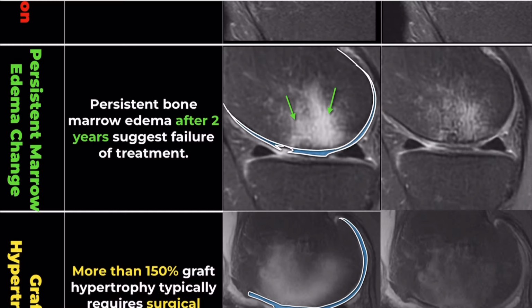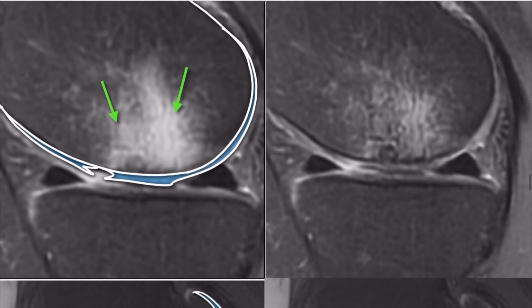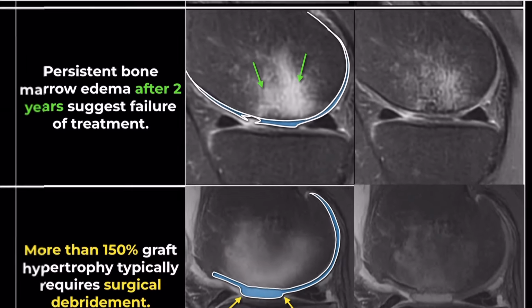4. Interface between repair tissue and native cartilage. A smooth interface without gap formation between the repair tissue and the native cartilage generally indicates successful integration. However, as seen here, the presence of fissures at the periphery suggests incomplete integration of the repair tissue.